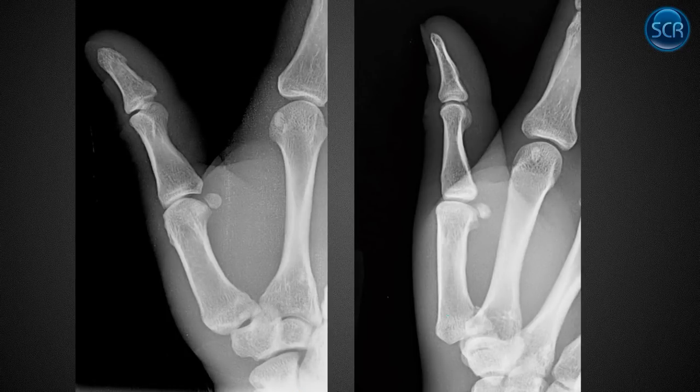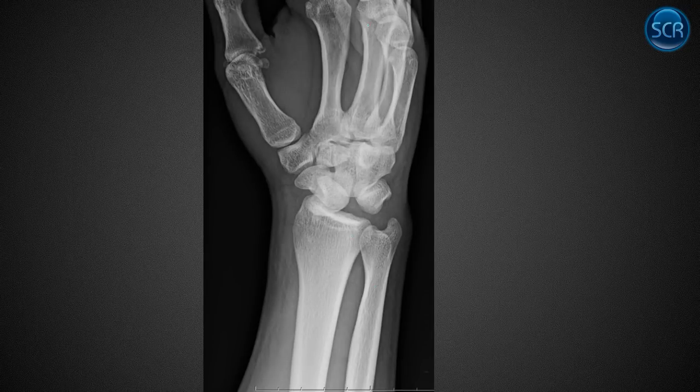If it's comminuted, if it's like all messed up down here, that's our Rolando fracture. This is an example of a gamekeeper's thumb, right? So we look at the base, right? This is what it should look like. But this shouldn't be there. So they've avulsed off their ulnar collateral ligament. This is a gamekeeper's thumb, or skier's thumb is another name for it, where you have a hyperabduction injury. Thumb gets bent out, tractions that ligament, and avulses it.